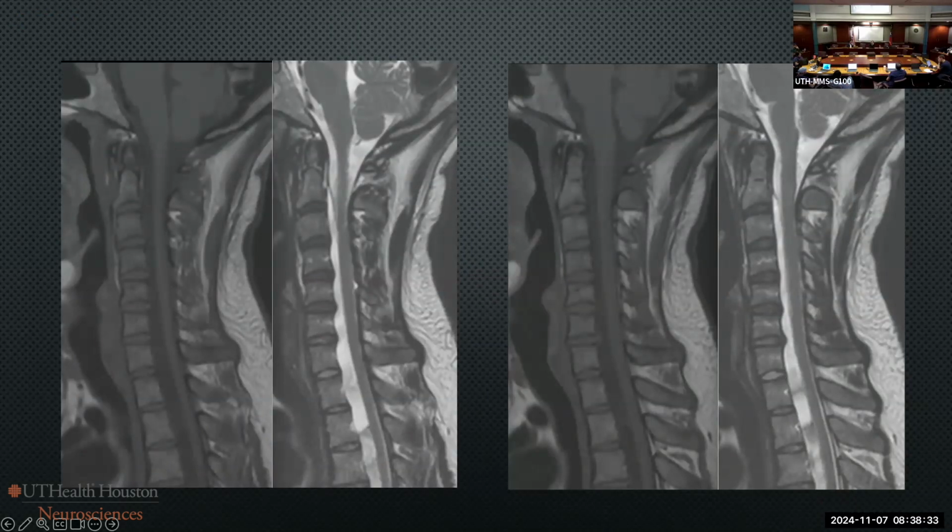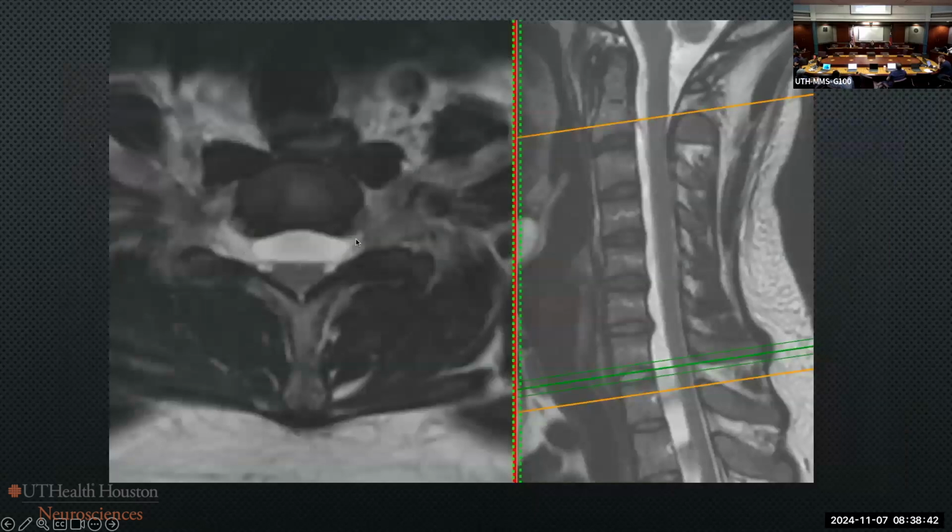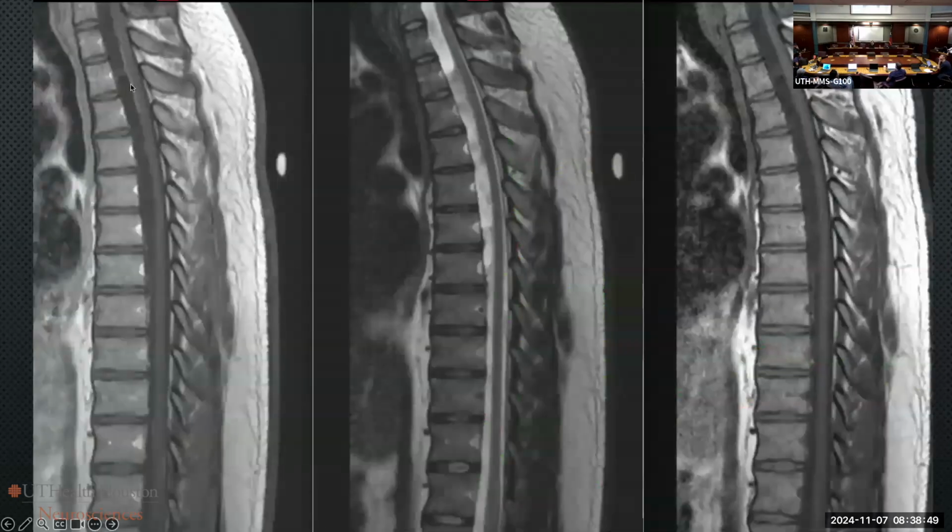And if you look up intracranially, you see this huge confluence of venous sinuses. You can see the dura deflected backwards here. On the axial images, this is a huge epidural collection compressing the cord posteriorly. He got gadolinium, and there's vessel enhancing, but there's no circumferential enhancement about this collection. Blood products are not layering posteriorly. So what this is, when you see fluid following CSF signal with maybe some turbulent flow, this is a big, fast leak.